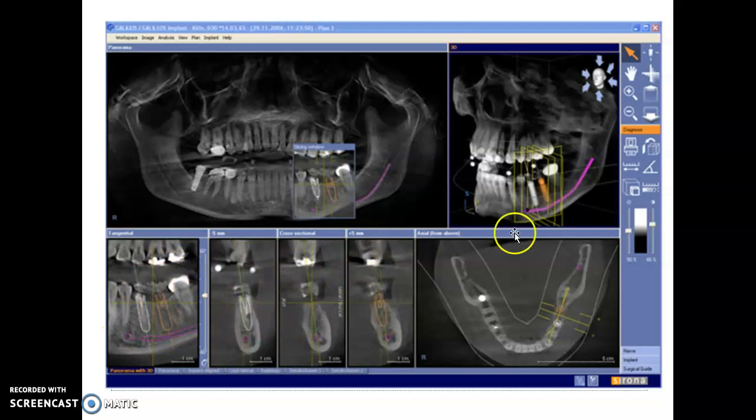These are the images where they're going in and slicing it. You can see there's 3 slices going this way. So you get the vertical slices. Those are the 3 vertical slices. This one square that comes across gives you a little panel that is more of a facial view. That's this view. And then you've got a line that comes across here, and that's that horizontal slice. Okay, so these are your 3 lines. This is your one that's going along the jawline.